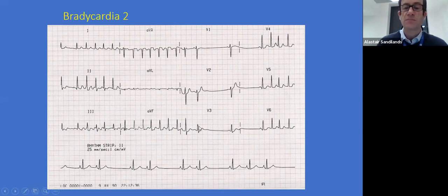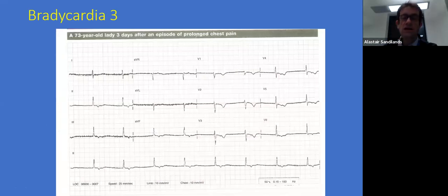bradycardia. So you can imagine these patients present with dizziness, blackouts. You certainly could do with a pacemaker to help their sinus node to speed it up. And then they can safely have medication to stop it going fast. So this is sinus bradycardia, but a form where the sinus node is not firing, okay? It perhaps can't be covered in the algorithm, or we haven't covered it. Okay, so sinus bradycardia, tachy-brady syndrome, sinoatrial exit block for that one. Okay, this is a good example.